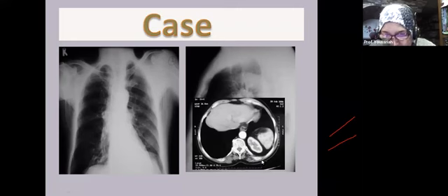How does it show itself in CT? This is a posterior lesion. As you can see, it abuts the wall with fat, and sometimes there is viscera, as in this case. So this is how Bochdalek hernia looks in PA, in lateral, and in CT.